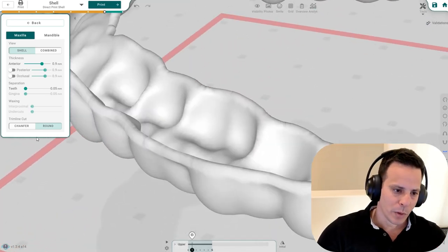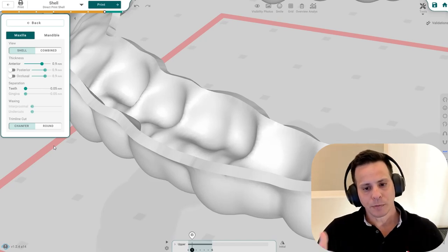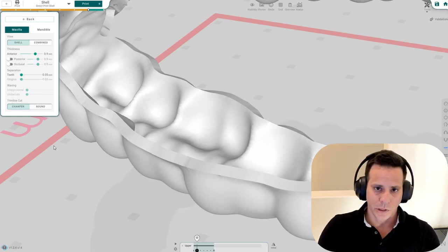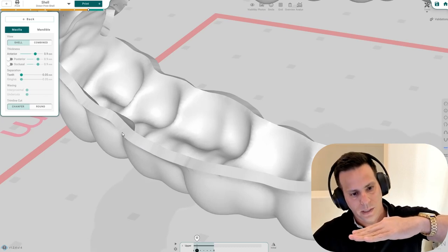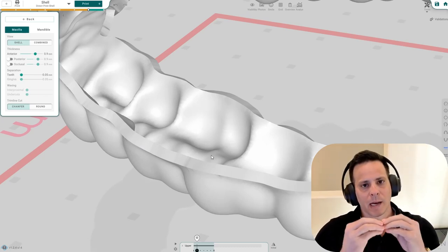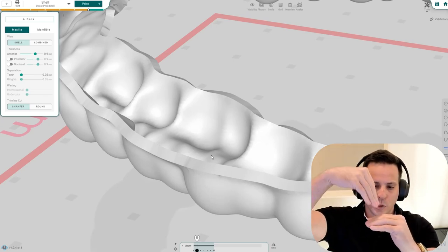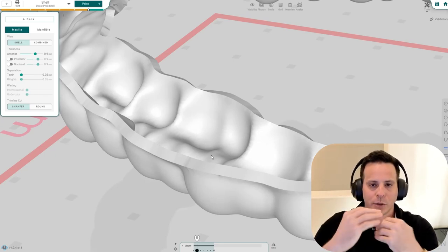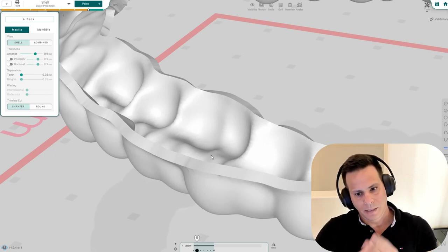Now, both are useful. The usefulness of them will depend on where you want to place the supports. If you're going to print it upside down and have the supports all over this area, then you want it to have that grip, that flatness. The supports are there, and then when you take them out, you can smooth it out, and you don't lose a lot of material. So you smooth out from there, and it becomes fine.